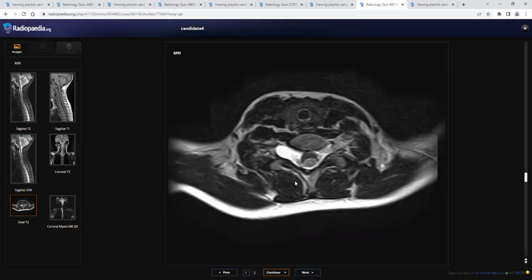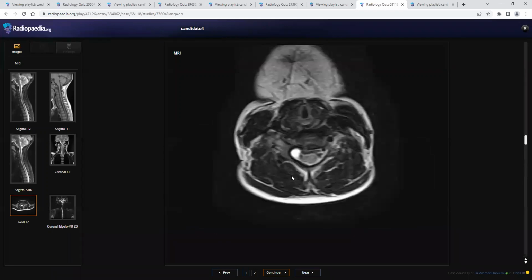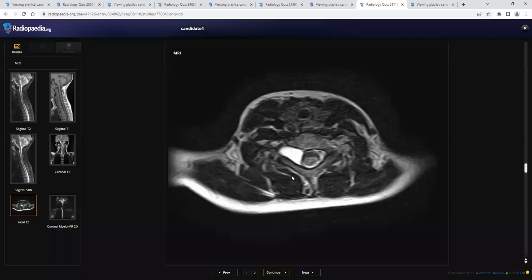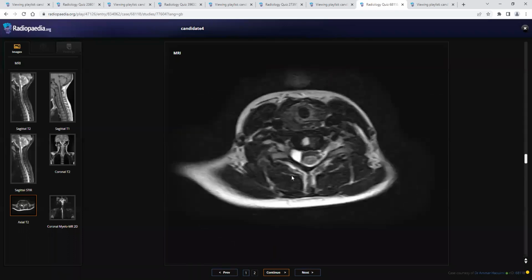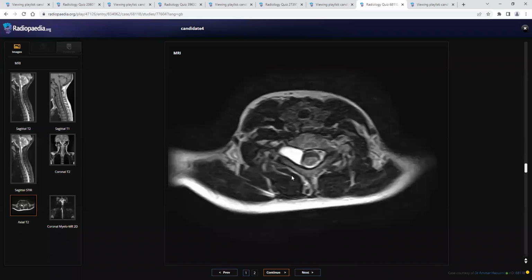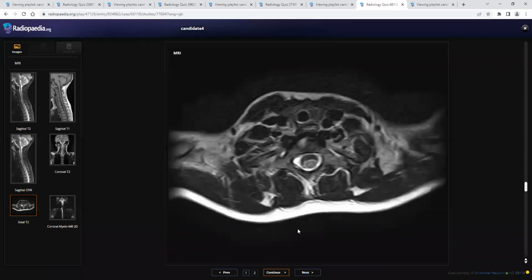Is there a history of any trauma in this case? Yeah, there was a history of difficult labor. He's a child of 11 years. Okay, so if it is a case of trauma, then I suspect pseudomeningocele in this case with root avulsion. Okay. Your next case.